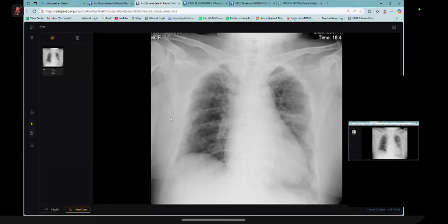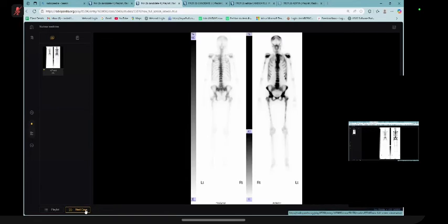So what will you do next? Sir, MRI spine preferably, and myeloma workup. I'm sorry, I'm going a bit fast. The diagnosis is myeloma here, and there are multiple tiny lucencies within the ribs, the spine, and the clavicles. If you see the left clavicle, it is difficult to pick. Many examiners' favorite case this is. Please always think about this whenever you hear elderly patient, bone pain. You should know this.